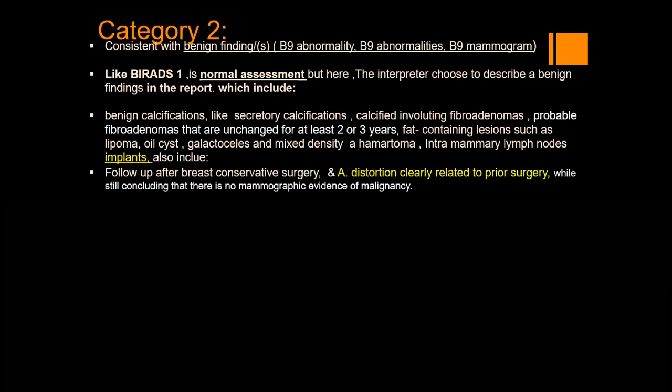residual disease. But based on mammography, since we could see only post-operative distortion, we have to say BIRAD 2, but we add this sentence. All of these changes have to have a characteristic benign appearance that can be labeled with confidence.